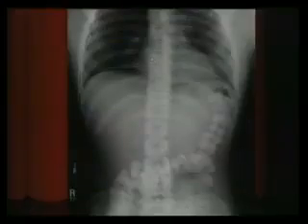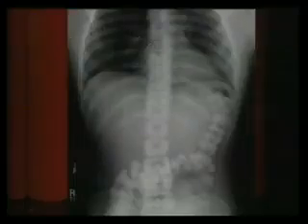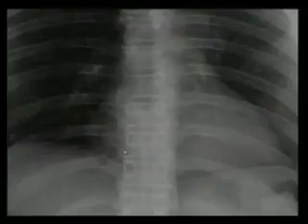Do you remember I always go pet, pet, pet, pet, pet? Whoa, there's not a pedicle here. Excellent. And all the residents always make fun of me when I go black hole, black circle, black hole, or black or white tumor, black or white mass, and pet, pet, pet. They make fun of me.